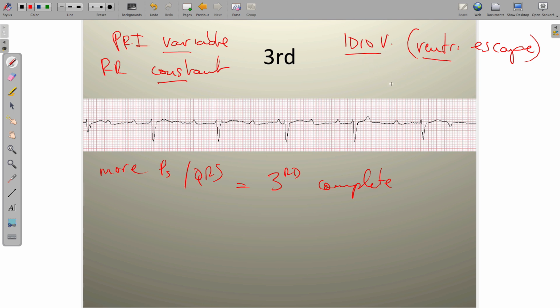They're both exactly the same in appearance, but it was how this ventricular escape got there. So in this case, what we have is we have a 100% blockage of the AV node. So there is absolutely no atrial or sinus node activity that's making it down to the level of the ventricles. So you'll see that we actually have sinus rhythm here.